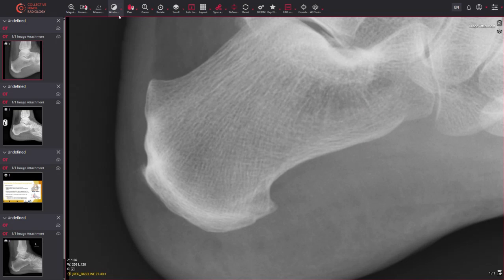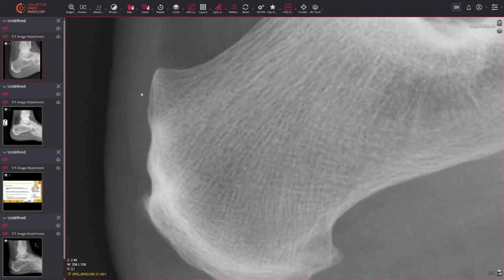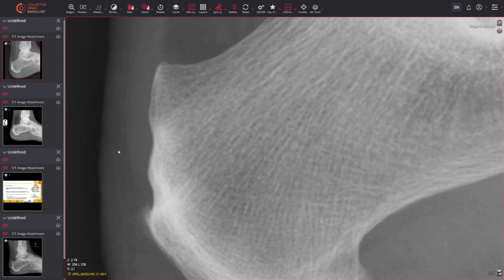The next thing we're going to focus on is this area here. And this is a similar principle. So this is the site of the Achilles tendon insertion. And you see the Achilles running up here. If we zoom in, you can see the difference in contrast between this area of tissue here and this slightly denser area of tissue here with a definite interface there.